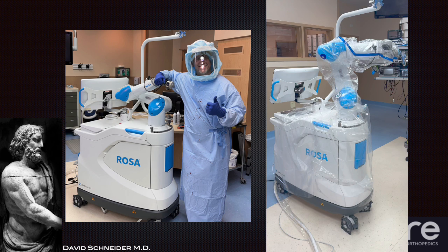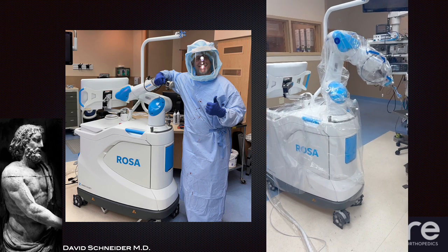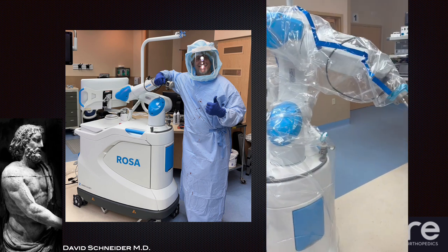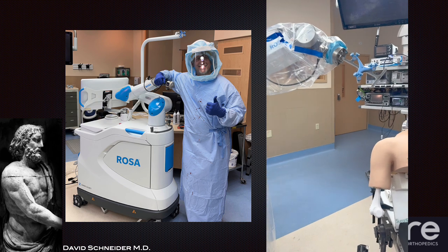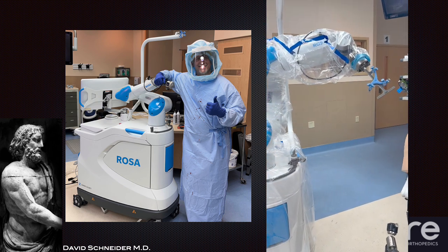My colleagues and I from the Mayo Clinic and other very prestigious facilities have been at this for about 4 years, working on cadavers, but just in 2024 we're using it. So you can see the implant. I left the volume on so you can see the chiming. This is what we do ahead of time. People think when we say robot, are we talking about a lost in space kind of a Jimmy Neutron thing? No, this is this mechanical arm that can bend and twist.